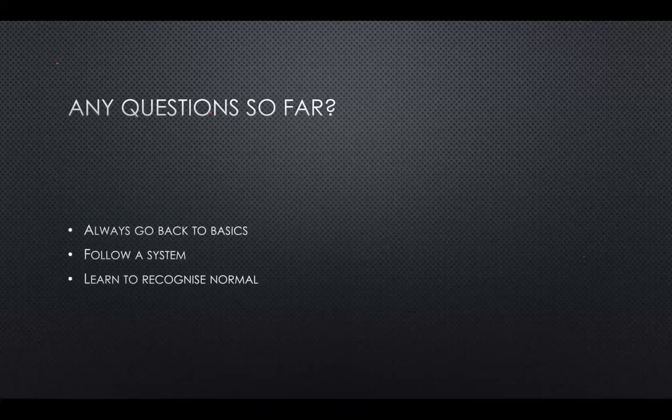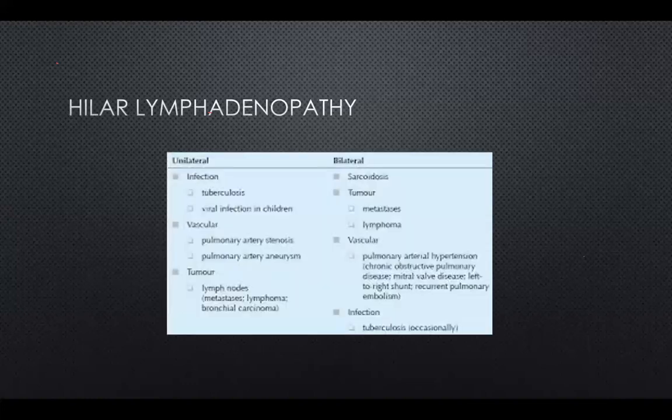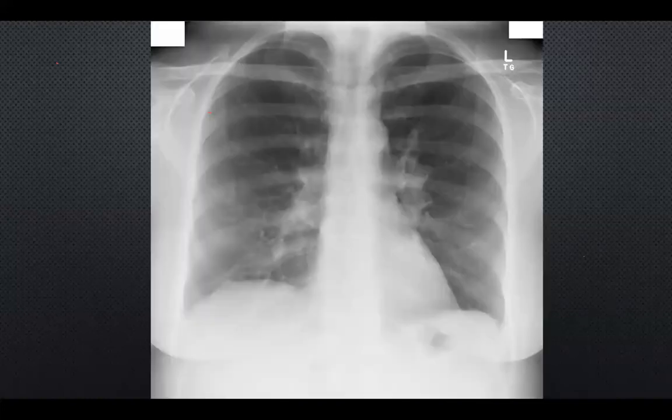Oh, I don't speak that. Sorry, what's the key point for diagnosing sarcoidosis? Yes. I think one of the key findings would be your bilateral hilar lymphadenopathy. That would be one of the first things that you'll pick up on with sarcoid. And that's before the lungs get affected so much that you will see it on a chest X-ray.